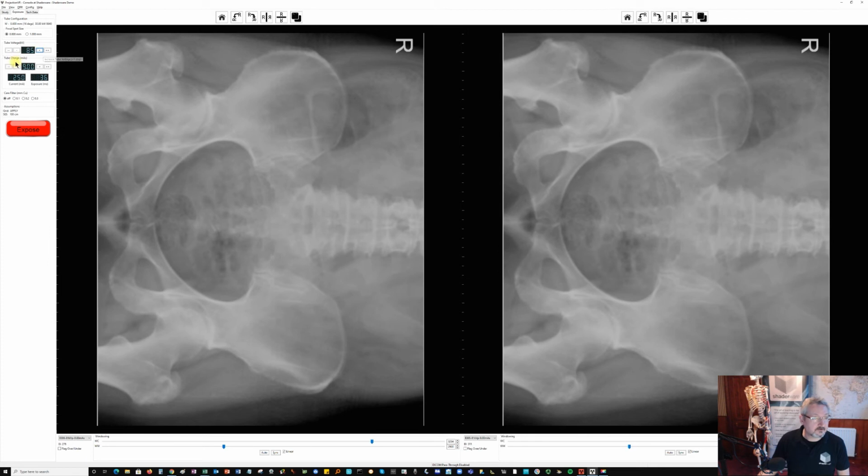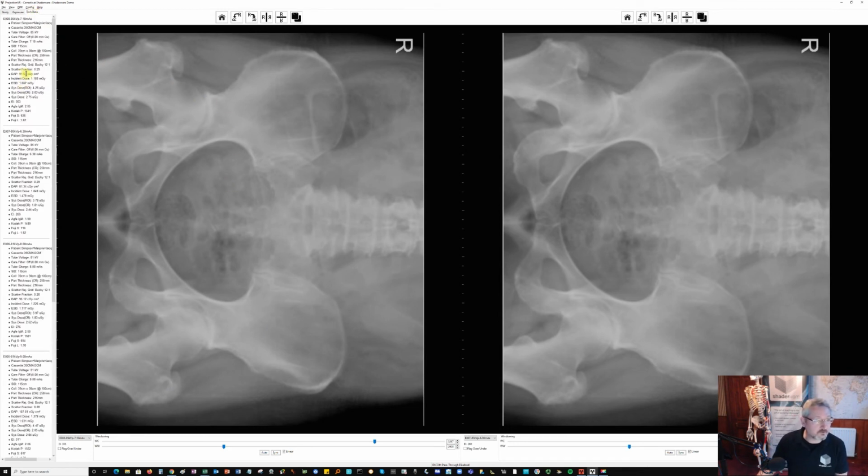And then we go back to 85. Now should go down to about 6.3, because that's half what was originally 12.5. 269, so go up 1. 303. Okay, and the DAP for that is 91.6. So Alt tab, that's exposure 8.